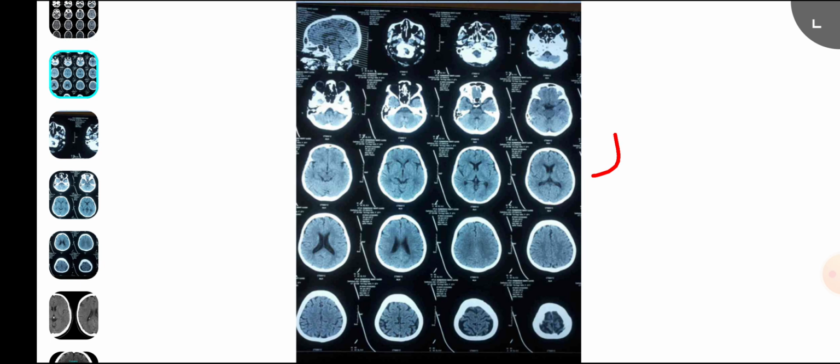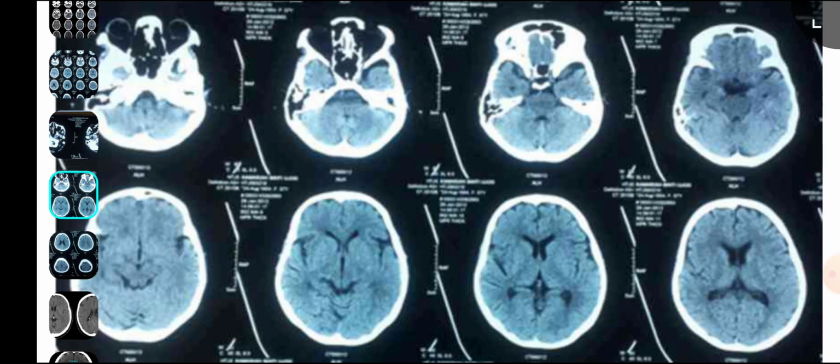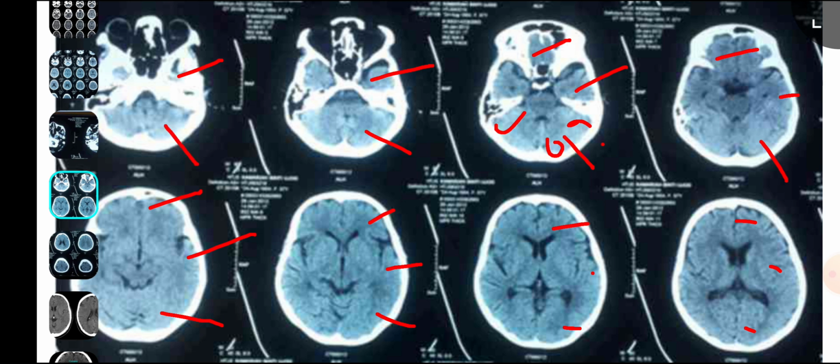Now we are going to see these two slices. So frontal, parietal, occipital, okay. Then frontal, temporal, occipital. Frontal, a smaller one, temporal, and here you can see occipital a little bit, and it's cerebellum now. Again it's temporal and cerebellum. Temporal, a smaller one, and the cerebellum.